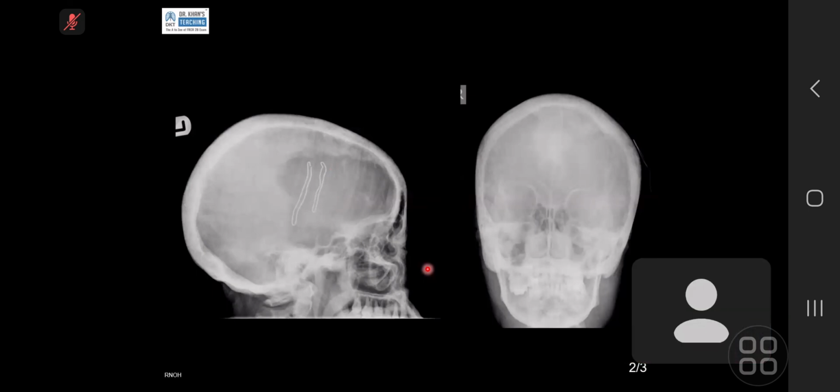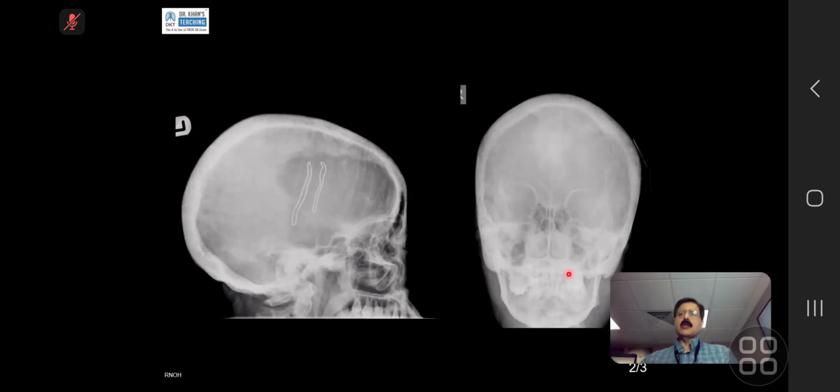Okay. What is your diagnosis? My diagnosis, it could be changes of a metabolic lesion. I will put on my differential diagnosis Paget disease, which can cause thickening of the skull and can also cause the lucent lesion in the frontal aspect. Excellent. Well done. Well done.